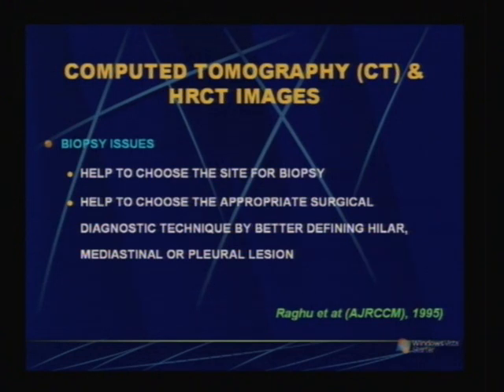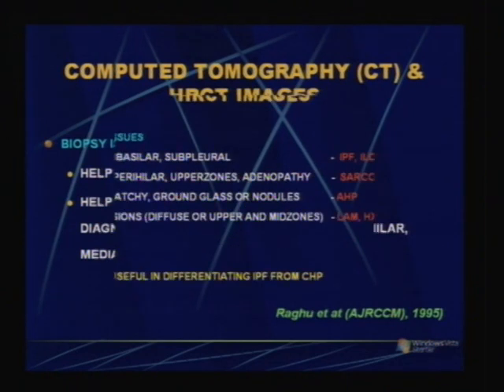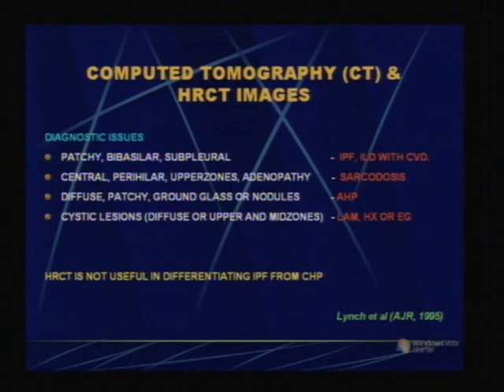Although in idiopathic interstitial pneumonias, the various HRCT patterns are diagnostic and histopathology is not required in the majority of cases, there is a subgroup of these conditions where biopsy becomes mandatory to confirm the diagnosis, and in this situation HRCT helps us in choosing the right site for taking these biopsies.